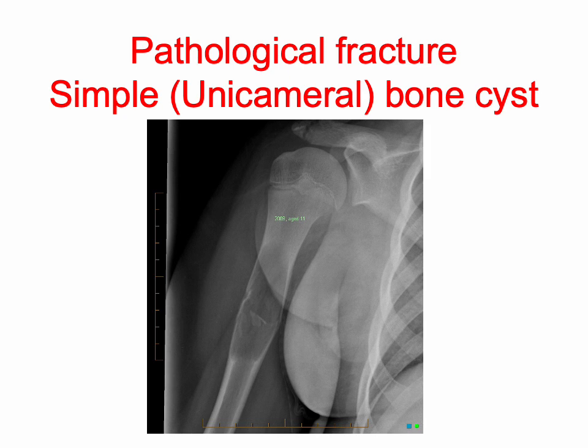It's centrally located. This is a skeletally immature individual in that their growth plates are still open. And this is associated with a fracture. You can see a fracture line here, and we've got this fallen fragment sign as well, another fracture line there.